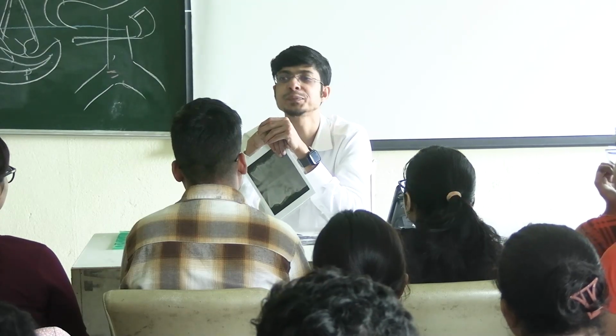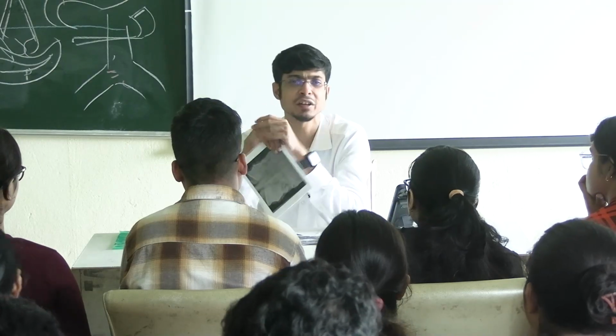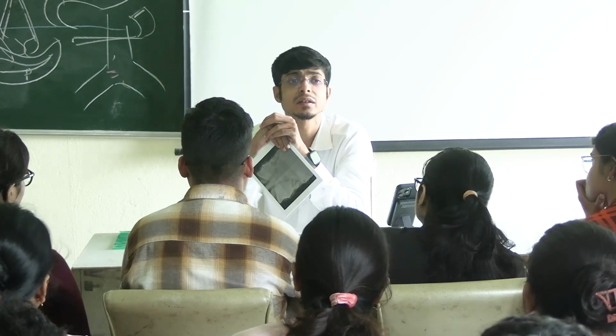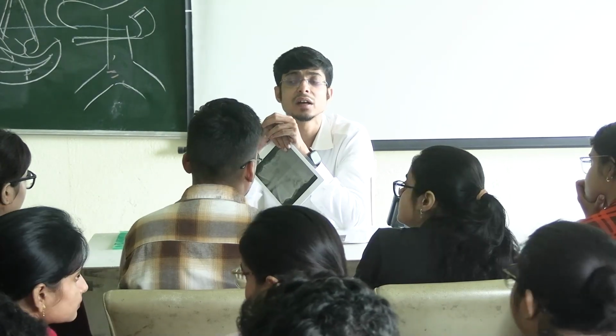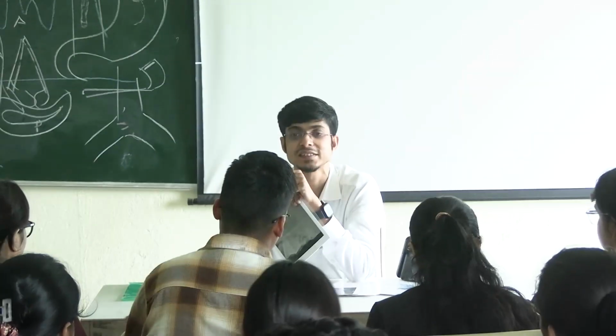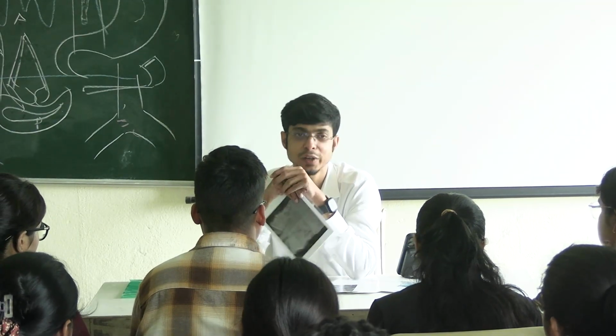সবসময় just don't see the most important thing. Try to follow it. Even when you are seeing a simple X-ray chest PA view for any lung disease, say we are seeing an X-ray for any respiratory breathing difficulty, respiratory stress, whatever. কি দেখবি? How to read an X-ray? Any X-ray. You start with what? For example, say an X-ray chest. A for airway, B for bones, C for the cardiac shadow and associated, D for diaphragms. See, you always go step by step. That is a very good way of seeing it.